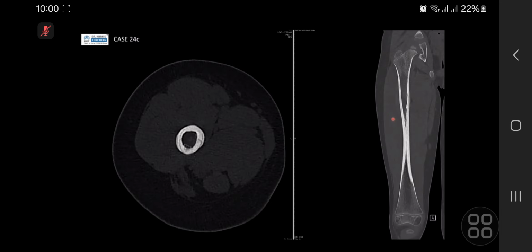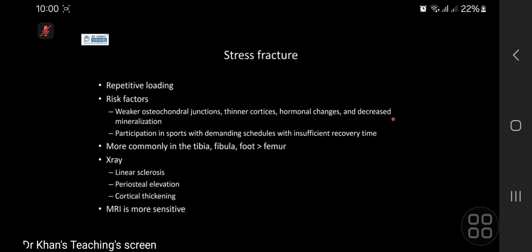So she had a whole body MR, and the marrow edema had actually improved, and she had no other lesions elsewhere. So this was treated as a stress fracture. Stress fractures in kids, you often see in the tibia, you think of shin splints, often in the sportsperson. A femoral one is slightly more rare, but still can happen. And on X-ray, it can be quite subtle.